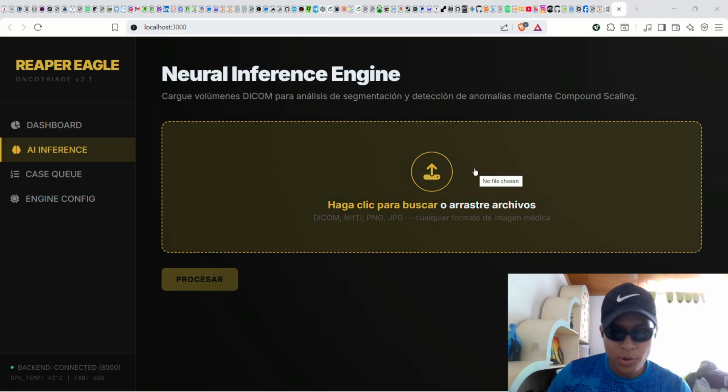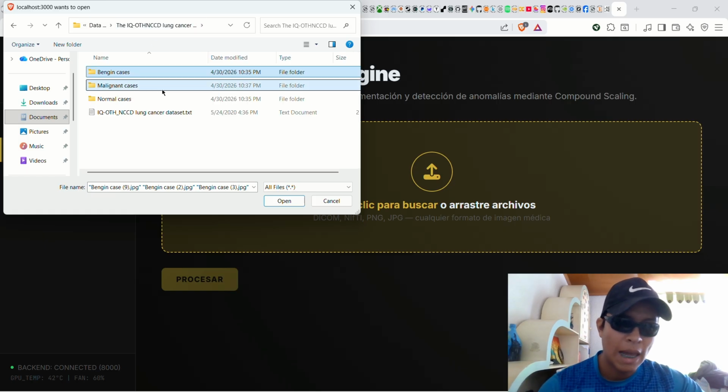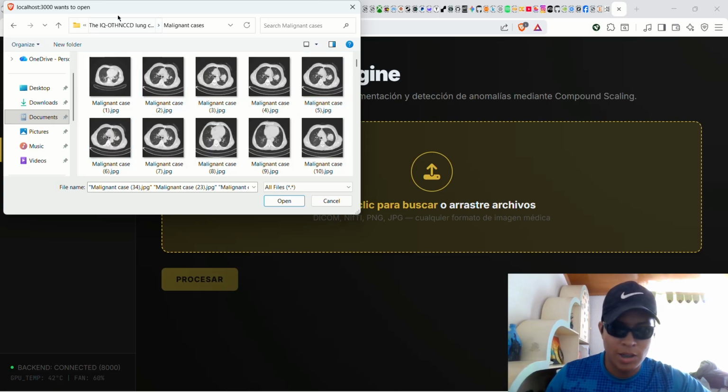But that model is a black box. And I will go into further detail with my software here because it's self-explanatory. What I mean by this software not being a black box is that when you process an X-ray, you can have normal cases.